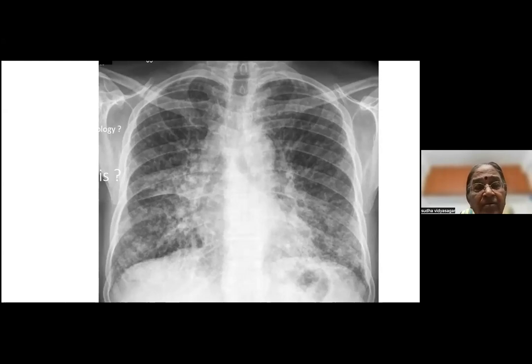No, that was not pulmonary edema. Okay, go on. Somebody is calling this sarcoid. How did you describe this X-ray? Somebody called it emphysema, ILD. It's not emphysema, right? In emphysema, you have a tubular heart, flattened diaphragm, wide rib spaces, and nothing of that is there. It's bilateral. Somebody is calling it perihilar adenopathy. I don't see much. It's a bilateral, non-homogeneous opacity.